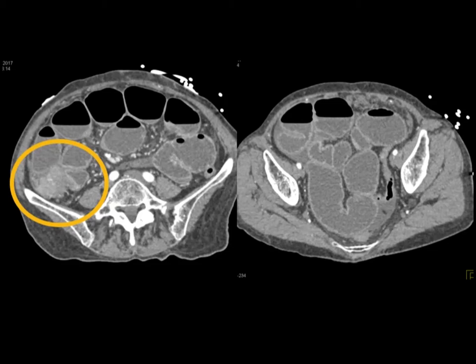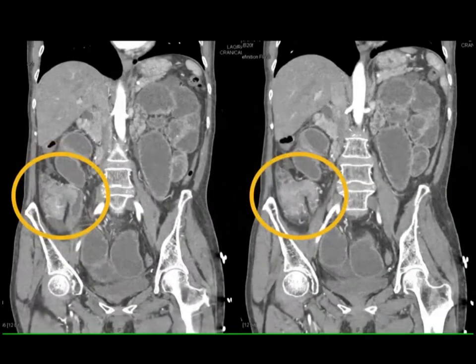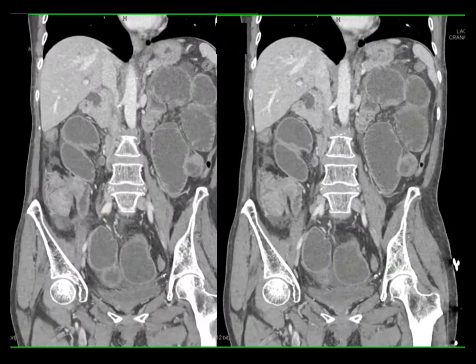You very nicely see the differential enhancement, comparing it to the dilated fluid-filled small bowel. You particularly see it nicely on the coronal view. Look at the extension from ileum into cecum. Things that cross over, I guess occasionally a carcinoma can cross over, but you've got to be thinking lymphoma. And this indeed was a small bowel lymphoma intussuscepting into the patient's right colon, very nicely shown on these examples.